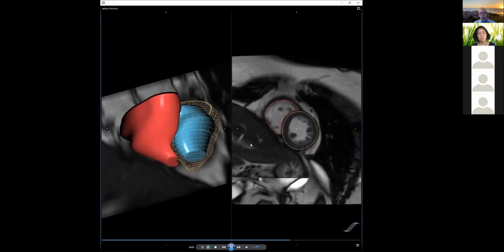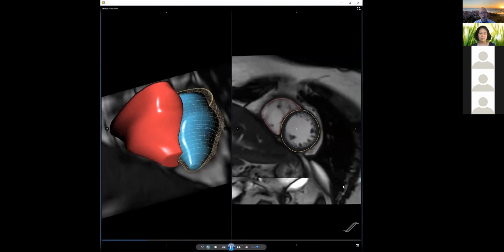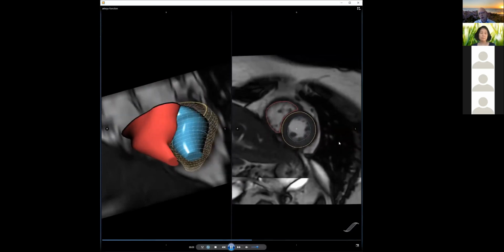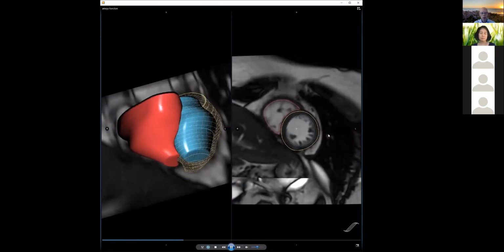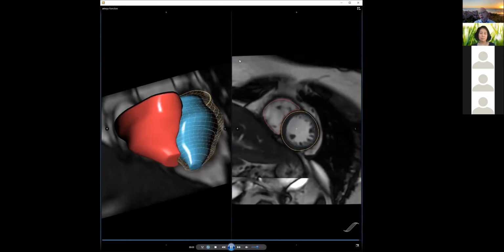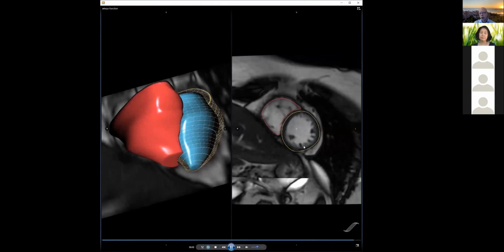Now, obviously, I didn't segment every cardiac phase. I only did the end diastolic and then systolic. I edited those two, but the rest are just the AI's initial guess for this case. When the image quality is this good, the AI does really, really well. Even at 3T, it does decently, but these are very clear.